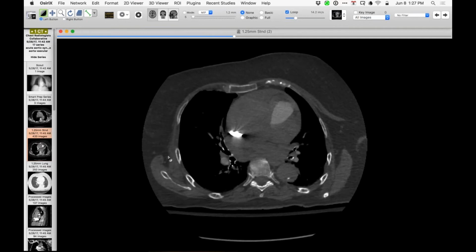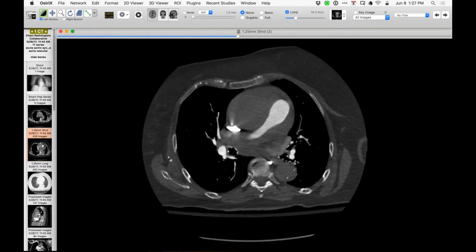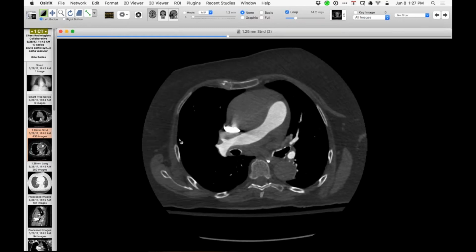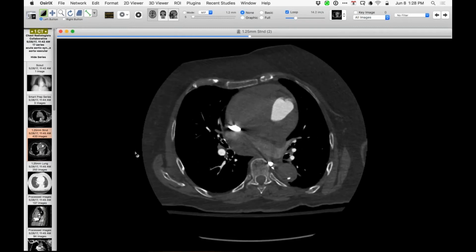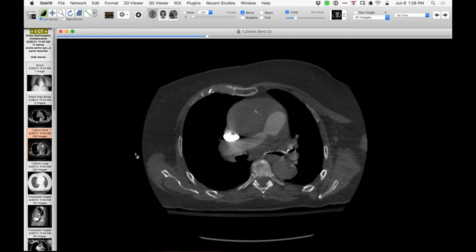Well, she's got compromised output. It's got to be what it is. It's either from reduced ejection fraction, or sometimes when the dissection involves a root. I saw your op note; it didn't involve the aortic valve, but that always scares me. Especially, you can see the ascending aorta is aneurysmal on that image. Yes, it is. I wonder how much tamponade she had at this point too, because she's got quite a bit of pericardial effusion here. That's why she has such sluggish output. Right, that would be a reasonable explanation too. But those types of studies make me nervous, and people don't appreciate the physiology of it.